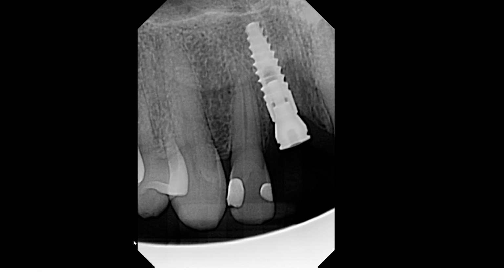However, I would say that this is still a clinically acceptable radiograph for what we want to see. But keep in mind that you could have a cone cut image where you have loss of significant anatomic structure, such as the crown of a tooth, or the root apices.